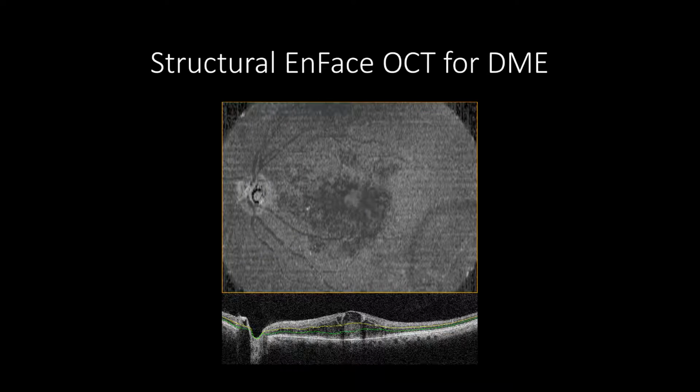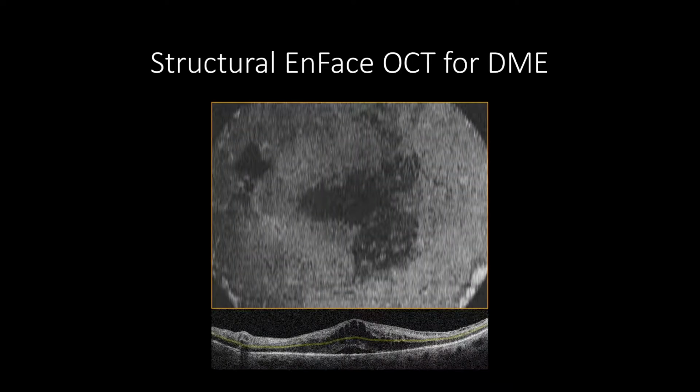When cysts have hyperreflective content, the IPL-INL slab on EnFace OCT will show cysts that appear hyperreflective compared to cysts with clear content. In cases of diabetic macular edema, the IPL-INL slab can help to assess connectivity integrity of the inner retinal layers, which may help in predicting visual prognosis.